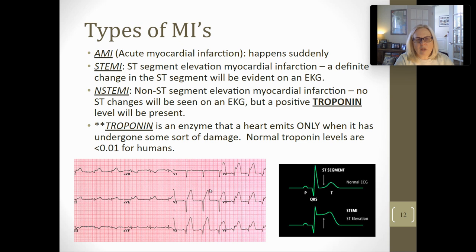And then it goes into this really tall T wave. Here's a fireman's hat, and here's a fireman's hat, and here's a fireman's hat. So 1, 2, 3, 4, I definitely have a blockage in the anterior region of the heart, as well as the apical, because 5 and 6 also have ST elevation. 5 and 6, that's the apical region, the one down in the apex, down in our armpit. Makes sense because 5 and 6 are placed in the armpit, right?